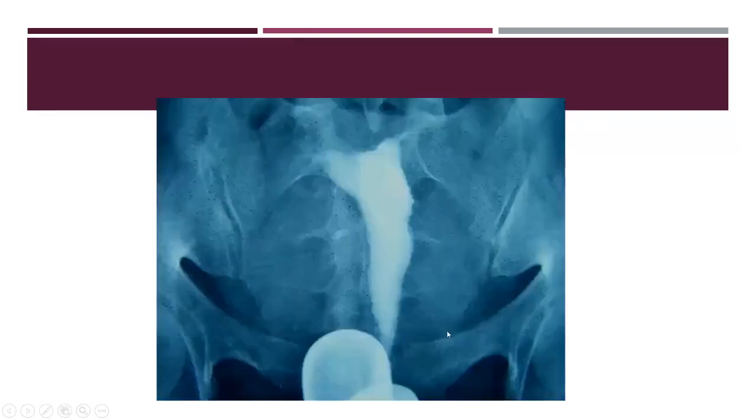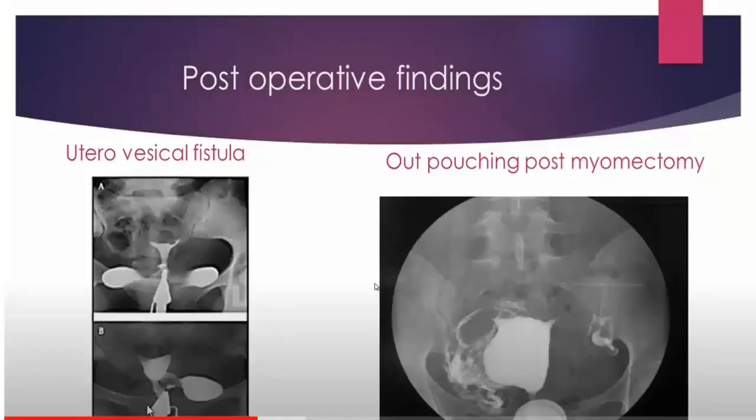So this is a fibroid. Again, a large fibroid uterus, large cavity with extrinsic indentations. Usually think of fibroid. And it is common with infertility.